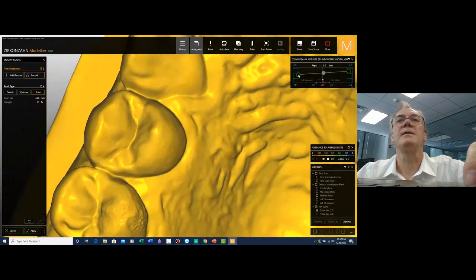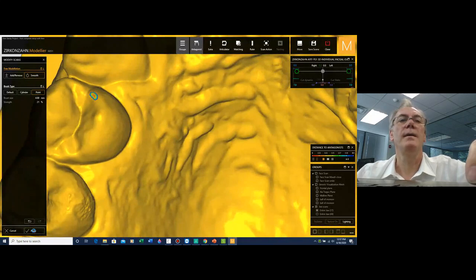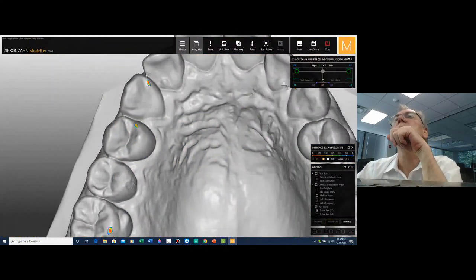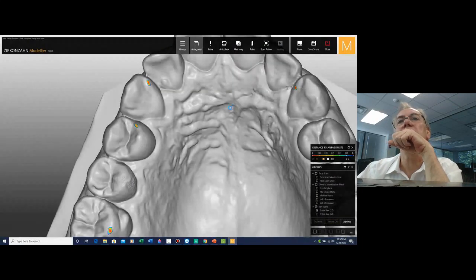Okay, it could be that it's still touching just a little bit, but at the moment it's going all the way through. We say okay. And we need to reactivate the articulator. So let's say yes, and let's reactivate.